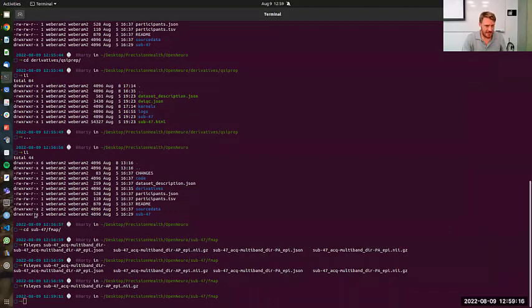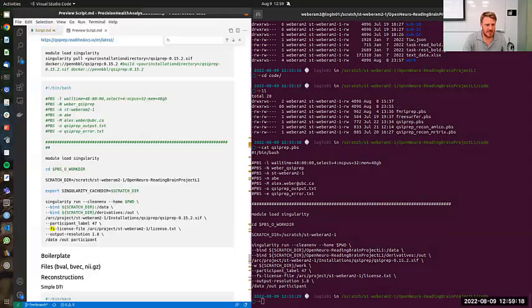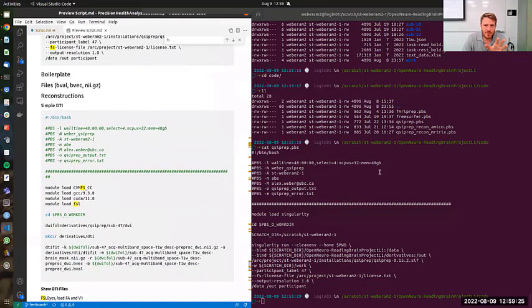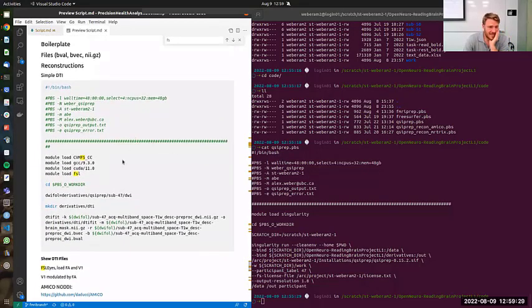Okay, so believe it or not, that is pretty much it in terms of QSIPrep. But I figure we have another hour. I'll probably end early, but I should show you some other stuff that we can do now that we've pre-processed our data. So one of them will be just using this tensor model. We're going to acquire, for instance, our primary vectors and our FA map.